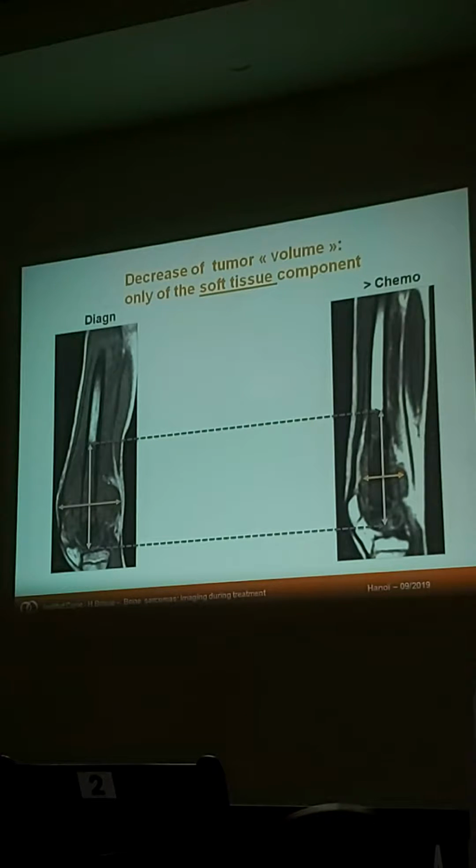He asks you how is the evolution of the tumor. Do we have some kind of response during treatment? Yes. The soft tissue mass is decreasing, so this is a good sign of response. I cannot say this patient will be a further bad or good responder. I don't know if it's more than 90% of the response histology, but I know there is some response to the treatment.